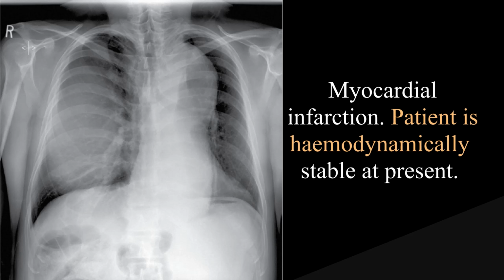Student doctor. Patient with history of myocardial infarction. Patient is hemodynamically stable at present. Report the chest radiograph first. This is a frontal chest radiograph of a skeletally mature patient.